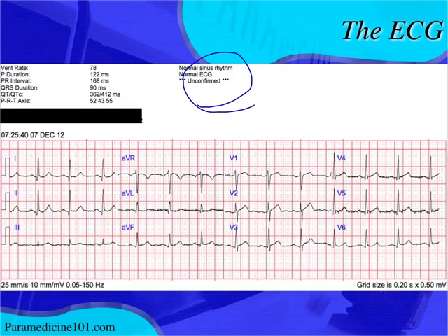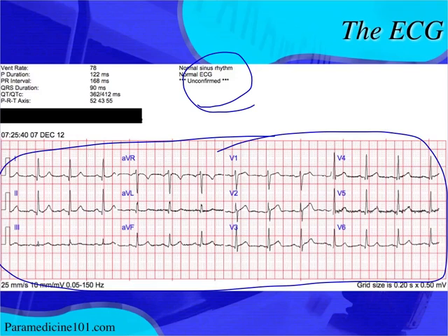But why is that? Because you gave nitro. Now, if you give nitro to an acute pericarditis patient, I don't think that you're going to have this pseudo-normalization here of the 12-lead EKG due to the nitrates, due to dilation of the coronary arteries. Now, with an acute MI, you might have some pseudo-normalization, like you see here, because of that increased collateral blood flow from dilating the coronary arteries.